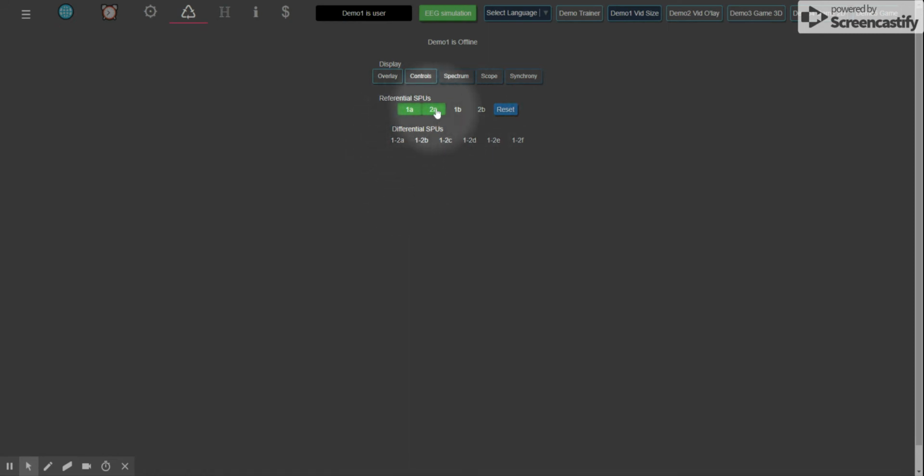The green means that they are active. And in fact, we can hide them further, but they're still green. They're active. These that have no highlights at all are not active. By active, we mean that they are configured to control feedback, whether it's the volume or the size of the video. If they're marked like this, they have some control function. These others are not used in this particular protocol.